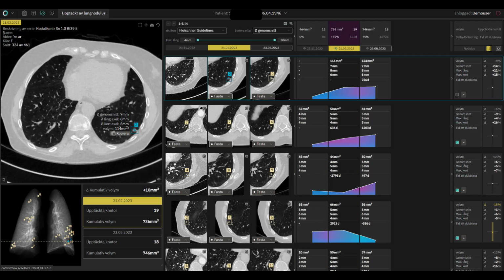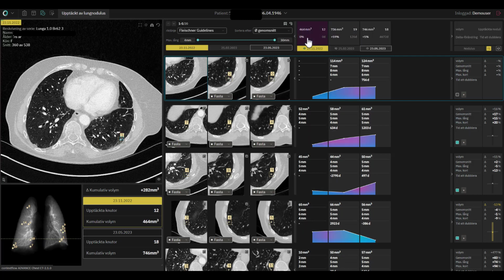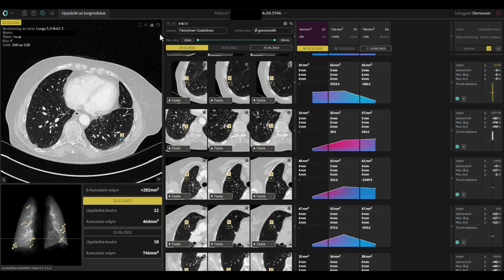The delta T1 reference can also easily be changed based upon the numbers of priors and other clinical circumstances. Finally, red color is used for fast progression, blue for status quo stable condition, and green for regression. Color grading is also influenced by how fast the changes appear.